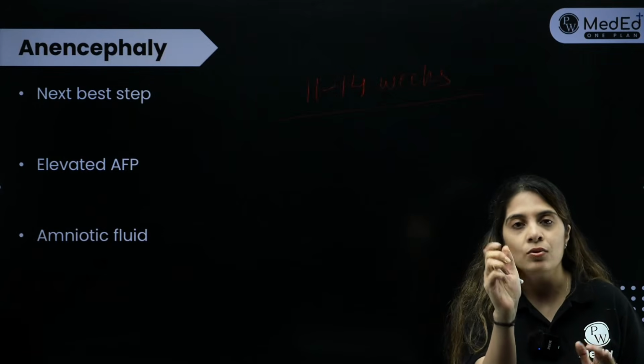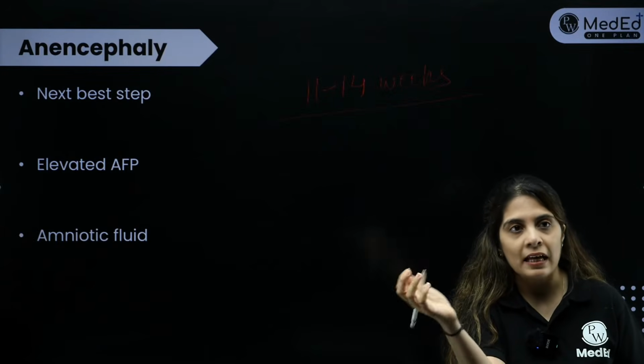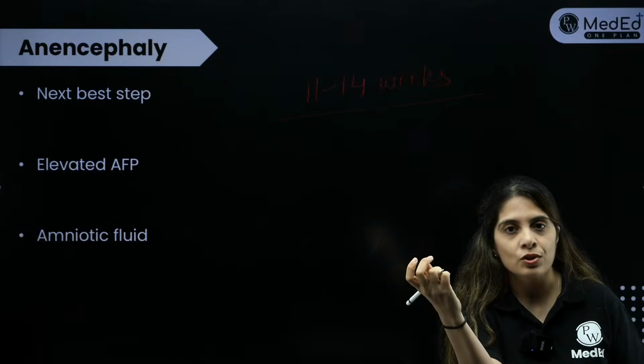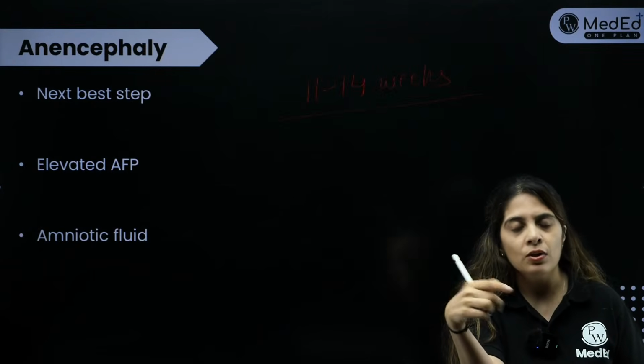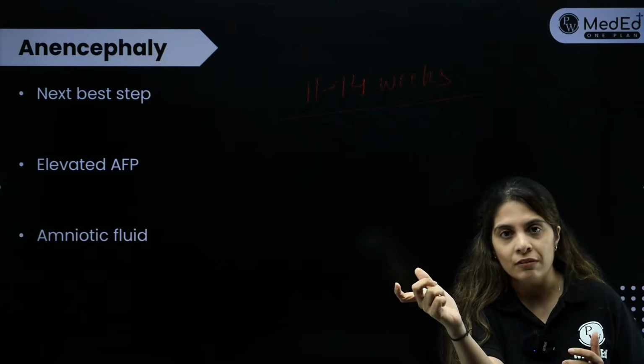Okay, this is absolutely, the baby will not survive, right? It is non-compatible with life, and the next best step you have to advise over here is, so they can just show you this video and then they can test you what is the next best step. The next best step is to abort the fetus, right?